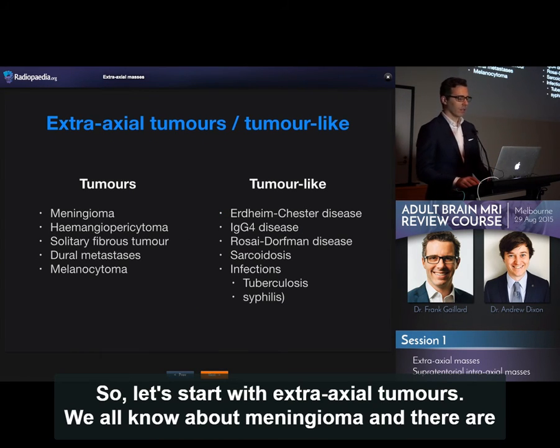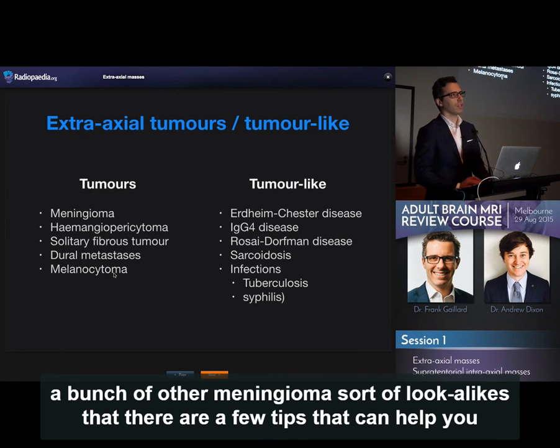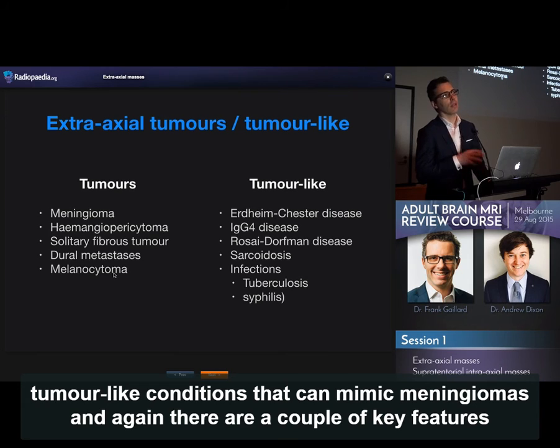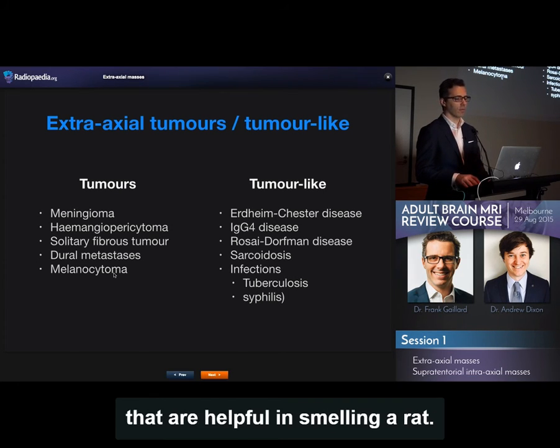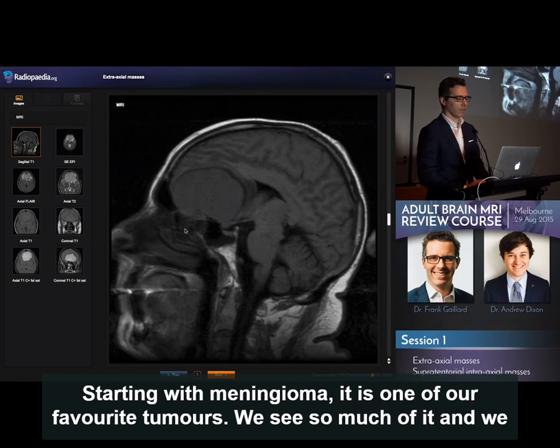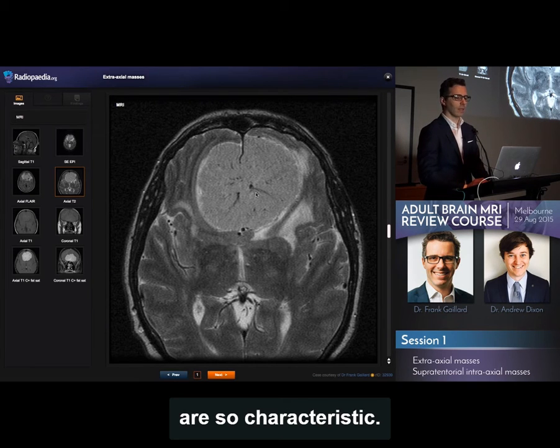So let's start with extra-axial tumours. We all know about meningioma, and there are a bunch of other meningioma lookalikes. There are a few tips that can help you decide whether or not to include them in your differential. And then there's a bunch of tumour-like conditions that can mimic meningiomas. Again, there are a couple of key features that are helpful in smelling a rat. Starting with meningioma, it's one of our favourite tumours. We see so much of it, and we usually get them right, both because it's so common and because the imaging characteristics are so characteristic.